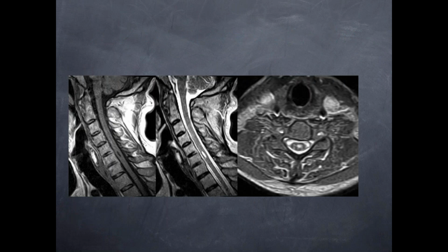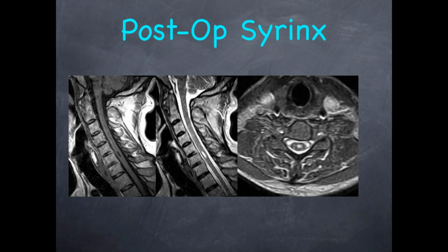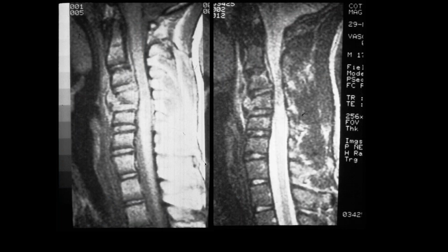Okay. Well, this looks a lot more focal, and I wonder, could this be like a focal syrinx maybe? Yeah, so this is a focal syrinx. In this particular case, this patient actually had surgery at this level. So this was thought to be a post-op syrinx, so you don't see the surgical changes here, but the patient did have surgery at this particular level. Okay. Shiv, what do you think of this one?